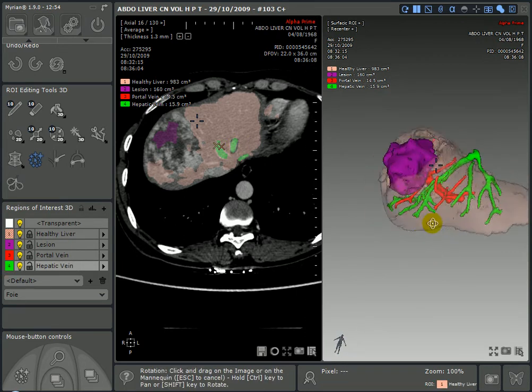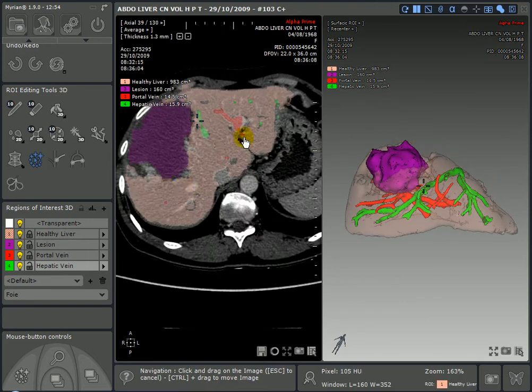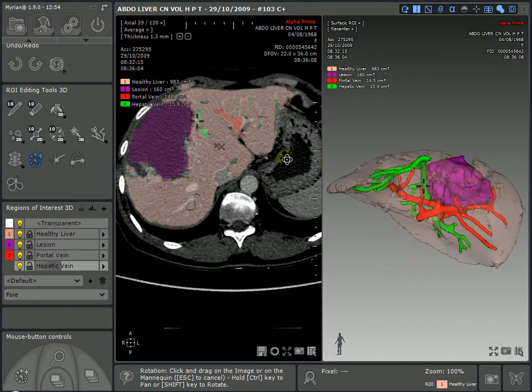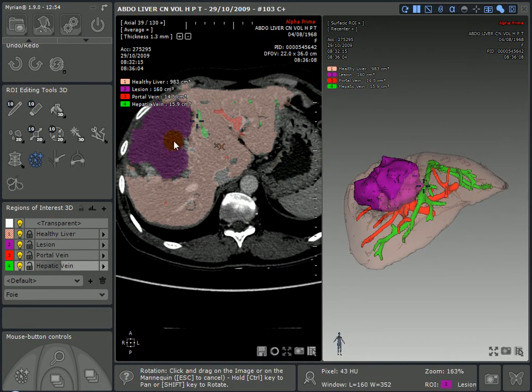Okay, so this is nice. If I want, I also go at this one. See, the segmentation efficiency is really image dependent. So based on the contrast, based on the motion artifact and the injection protocol, the result might require a few manual actions, but you see it's very easy, just click again and that's it.